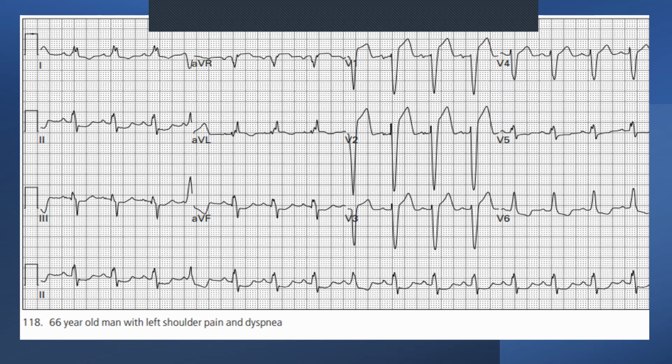Because regardless of whether the patient is having a myocardial infarct or not, because of the way that electricity is traveling through the heart, you tend to see these ST elevations in a lot of places and ST depressions. And this is what trips people up, because is this really an MI or not? So we're going to get into that. But let's just work according to our system now.